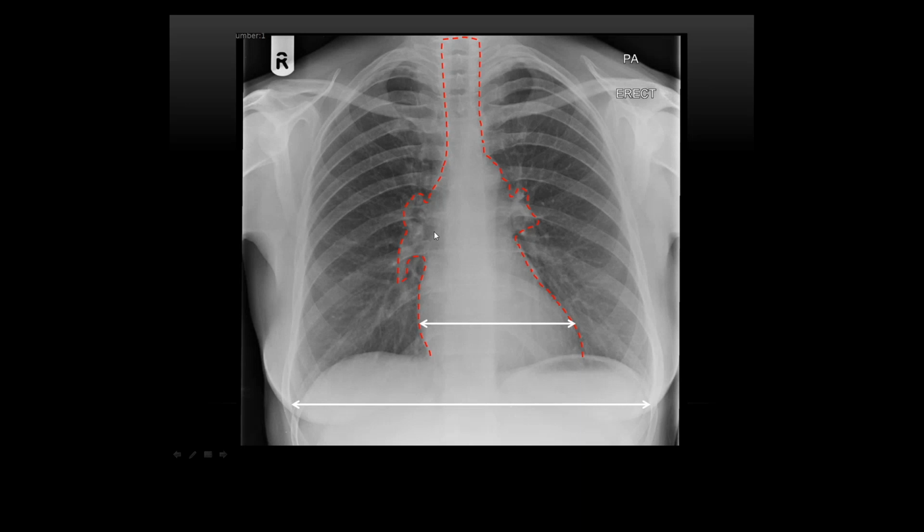Yes. Sorry, so your right is lower. Sorry, so your left is higher, your right is lower. Now, anyone know what the reason for that is? Vessels? No, it's a bit trickier than this. What happens with the pulmonary arteries? On the left, what happens?